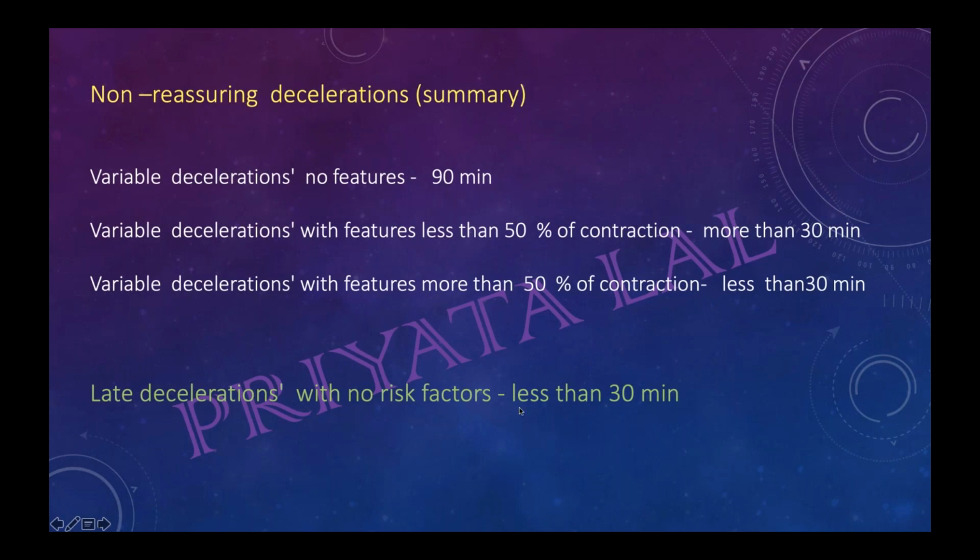Ma'am, I want to know, the trace is usually given as a 20-minute trace, but here how will we calculate 90 minutes and those things? That will come. It will be written in the scenario. Normally we have to read a 20-minute trace.